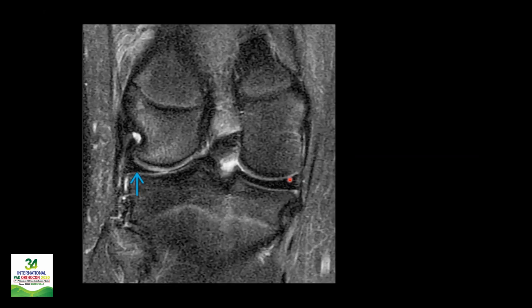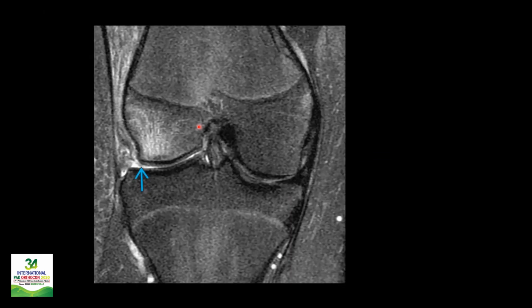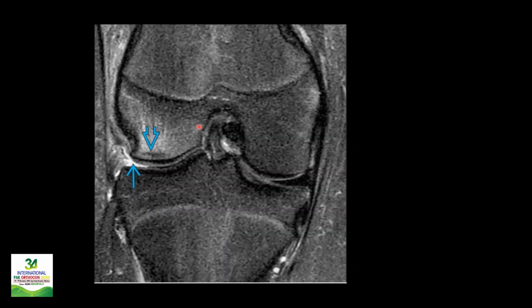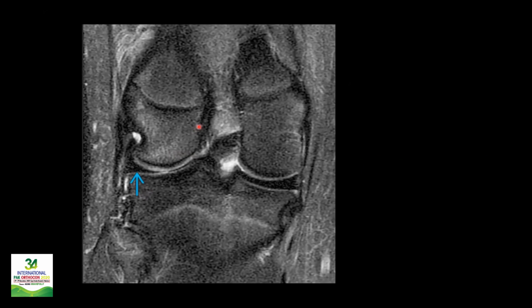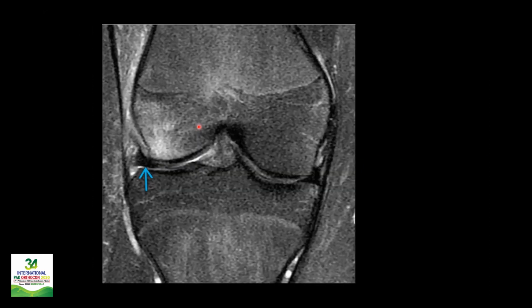Okay, so these are now 5 images. Still just a few, 1 or 2 more images to show. So now you will have to appreciate this region only. So where the arrow is there, what you see here is a meniscus. Then what happens? The meniscus starts to disappear, disappear, disappear, and then there is a meniscus again. So again, you see a meniscus, no meniscus, almost no meniscus, again no meniscus, and then the meniscus appears again.